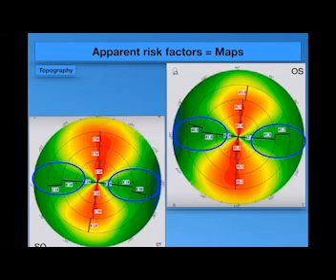Also the eye rubbing, if we consider that eye rubbing is one of the factors for ectasia, is moving the cornea from the superior to the inferior. So I asked many international refractive surgeons, reviewers and interpreters about the inverted keratoconus. They don't believe in what's called inverted keratoconus.